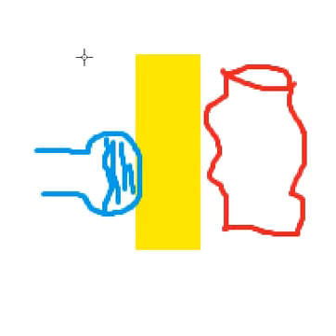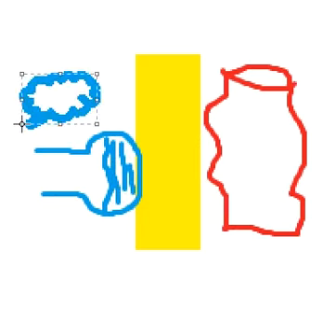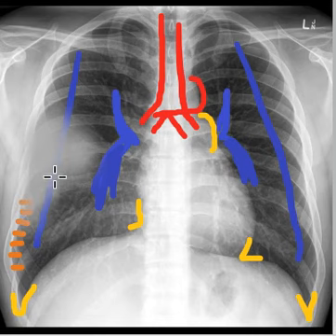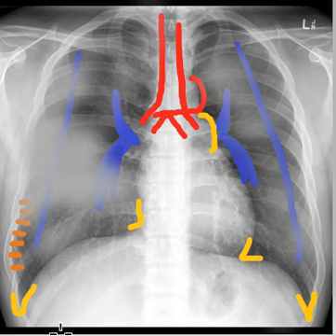The way you can see alveolar edema on a chest x-ray is that you will start to see clouds in the lung. There will be grey clouds in the lung, and that actually tells us that alveolar edema is occurring. So you look at the chest x-ray and you start having this cloudy kind of picture. This is showing us that now alveolar edema is also occurring. These clouds are present everywhere. It's not like it's just present in one area. It's basically a diffuse kind of appearance.